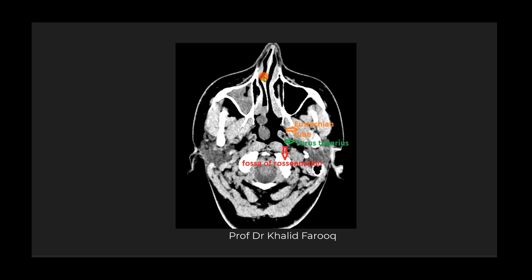Here we see this is right-sided DNS, inferior nasal turbinate, and this is a polypoidal soft tissue arising from the inferior nasal turbinate, extending posteriorly into the nasopharynx. So this is a nasal polyp. Here we see diffuse lobulated mucosal thickening in the right maxillary sinus.